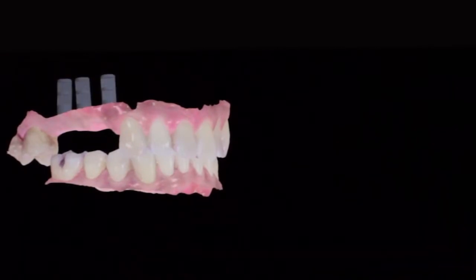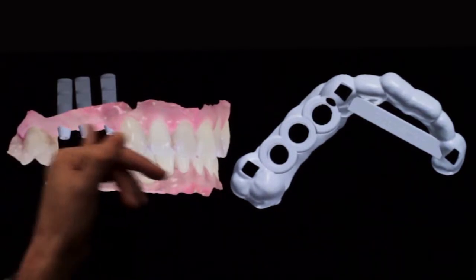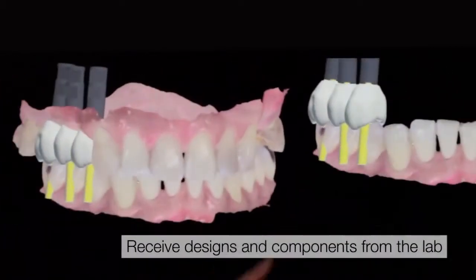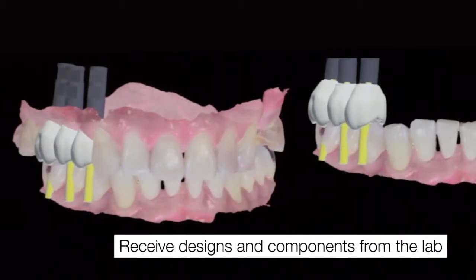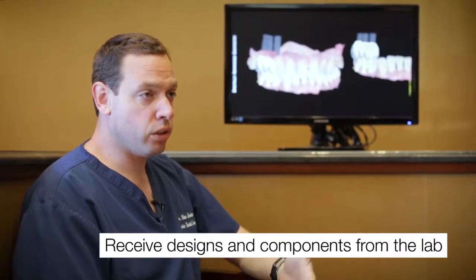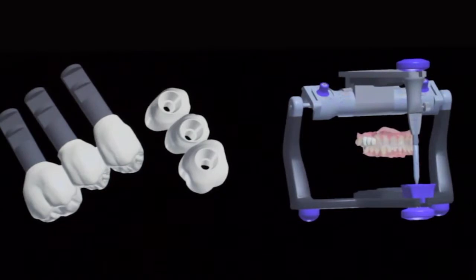The major advantage is that with these different data sets, the patient's upper jaw, the patient's lower jaw, the virtual implant position prior to the surgery, the restorative components we want to use, all of that comes together so that prior to finishing the virtual plan, we can even go ahead and design a screw-retained provisional, or even a provisional that is of the precision of where the implants will end up, so that we have a very nice way of immediately providing a restoration for this patient.